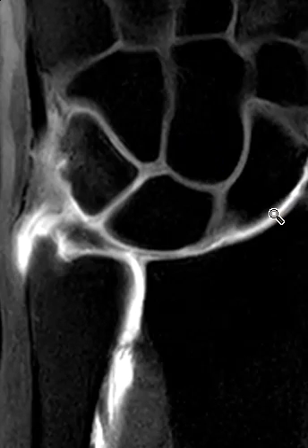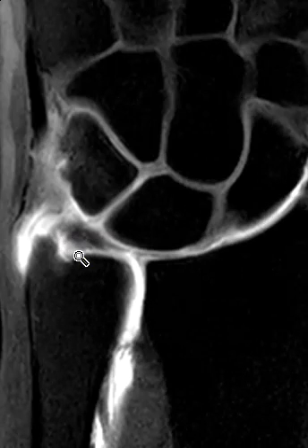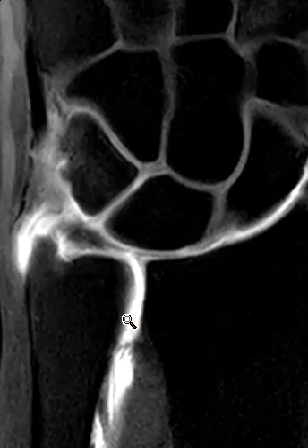Now we can see contrast was injected over here to the proximal carpal row. Contrast is undermining here where the foveal attachment is and where the styloid attachment is. It comes down across. It comes down here. It looks like it's also coming proximally beyond the distal radial ulnar joint here. And we're looking at this one last thing.